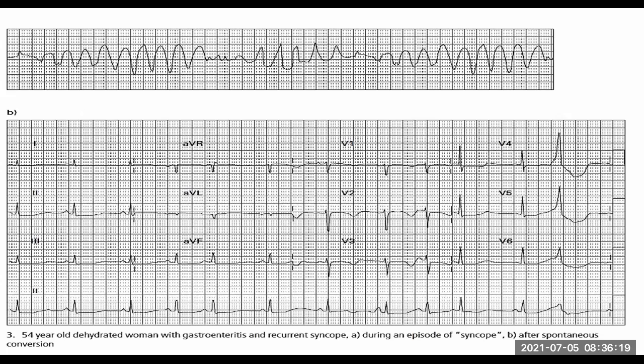So what do you see before? Is there anything strange that happens before that? Or what's supposed to come before a beat? A P wave. There's no P wave here. So that means the ventricle is just on its own. So it's a premature ventricular complex, or a PVC. Whereas if it was an atrial thing, then it'd be a premature atrial complex. So you get the idea of why that's happening. We've got this premature beat, but it's only coming up once. We've only seen it once.